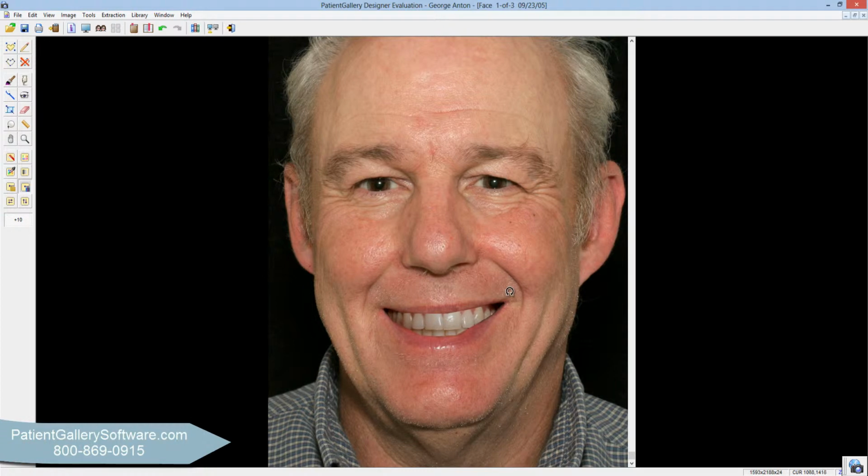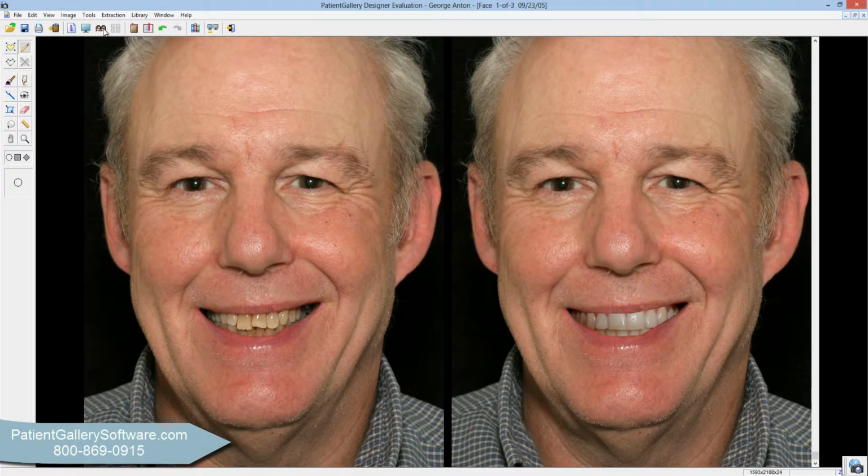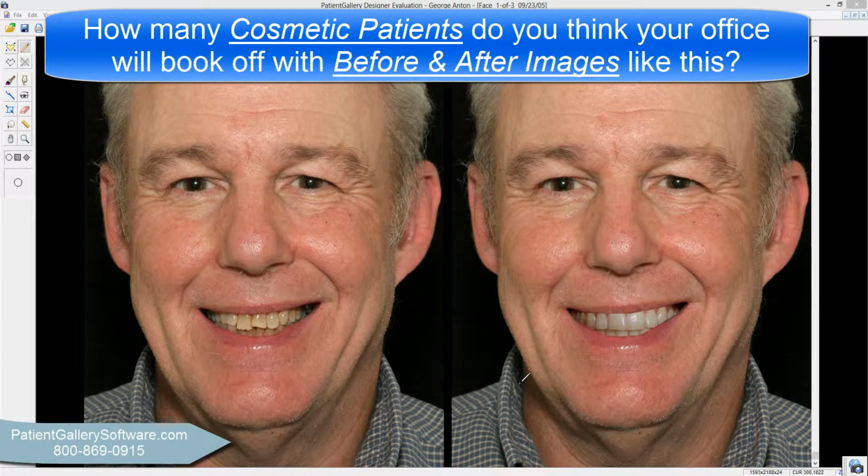We have full functionality that we can set this up any way that you'd like. And let's do another before and after here. I know I just asked you what do you think your patients would think about seeing themselves with their teeth whitened. Well, let me tell you, seeing them with a brand new smile in their mouth will certainly change their idea on cosmetics. One doctor told me that they had a patient that came back 10 months later with the picture in their hand and said, please, let's get started and do something like this.